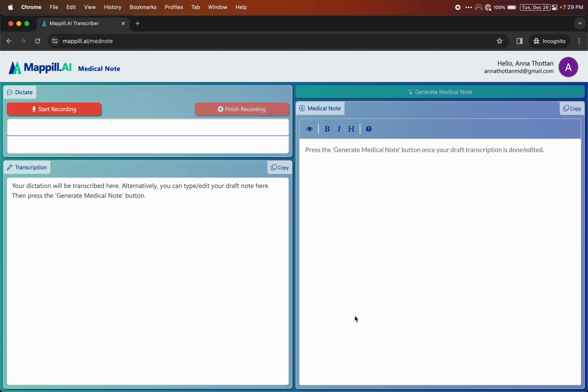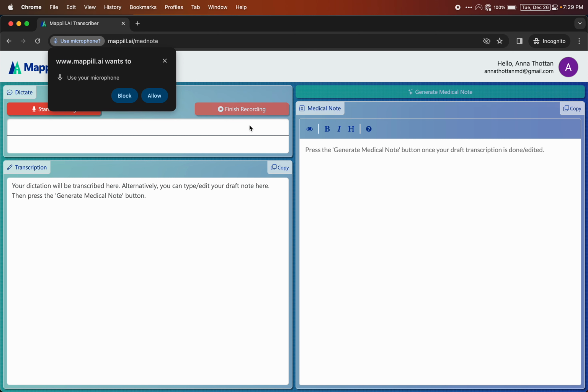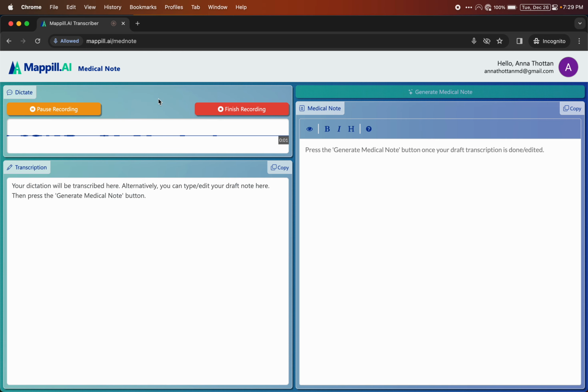This is a sample patient. It is just a test patient that I will be doing. This is the initial start screen. You start recording out here, and all it does is you allow the microphone access for the first time, and then you allow the microphone and it'll let you do this.